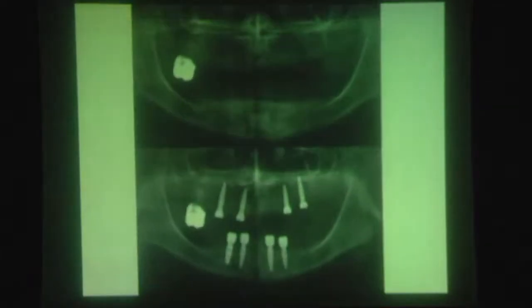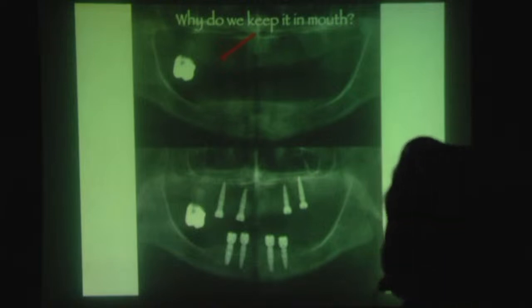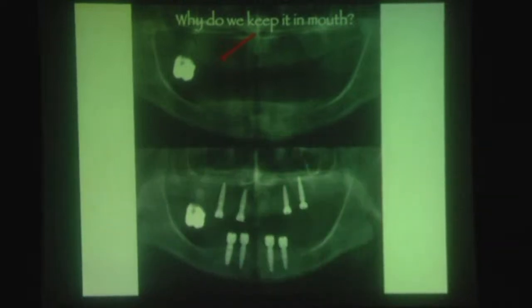So, look, you see the implants, everything went good, everything was as planned. But who can answer? Why do we keep this tooth in the mouth? Yes, doctor. You look so smart. So why do we keep it?